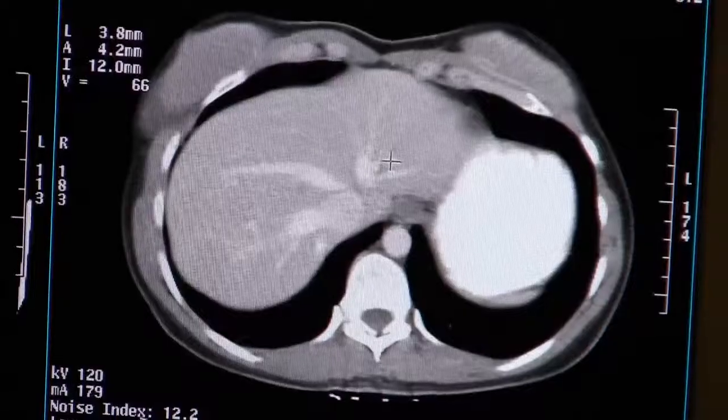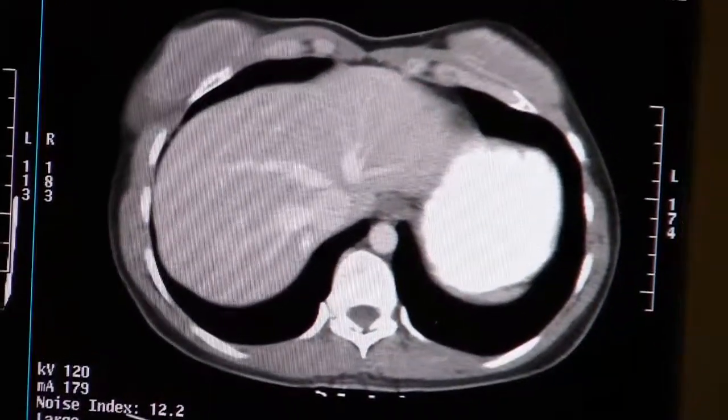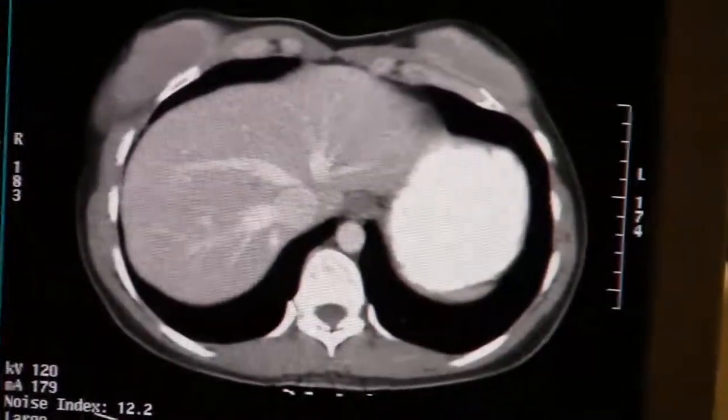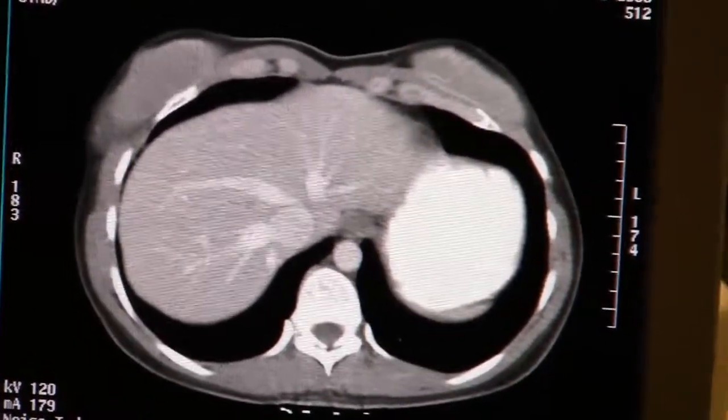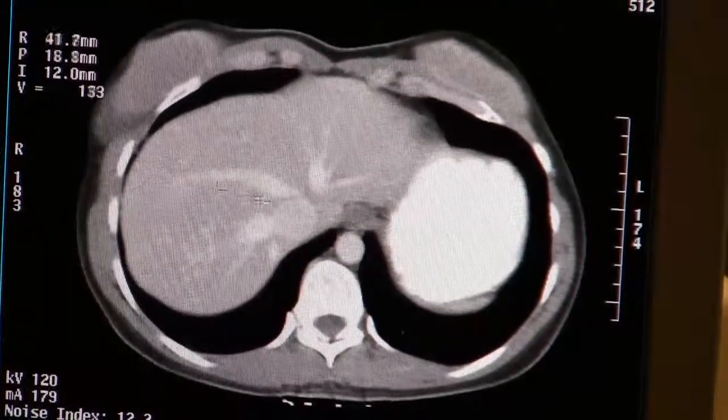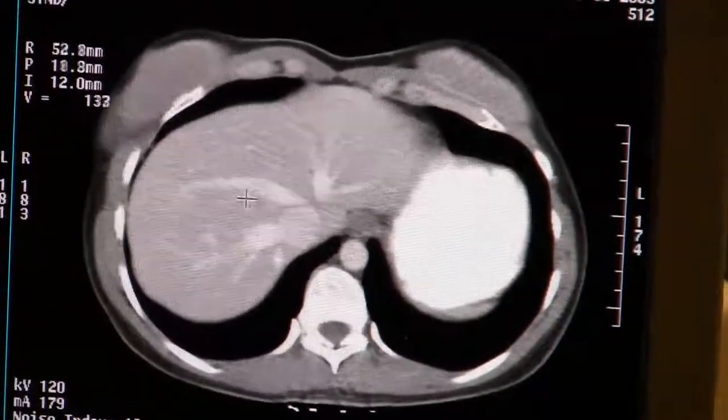And that's the difference between having one, I'll show you right here, the one that we saw before without, I'll get kind of to that same place. There's the liver without the contrast, and there it is with the contrast. And you see how different that is.